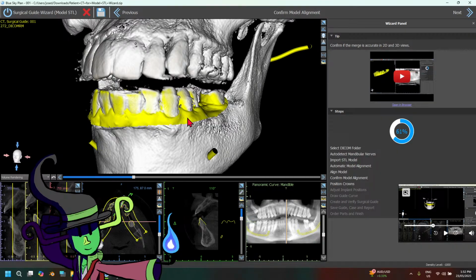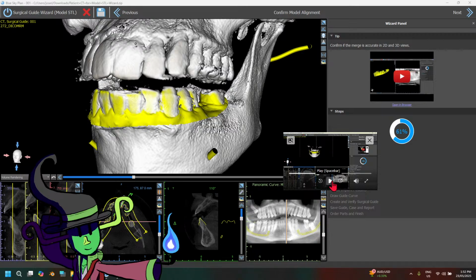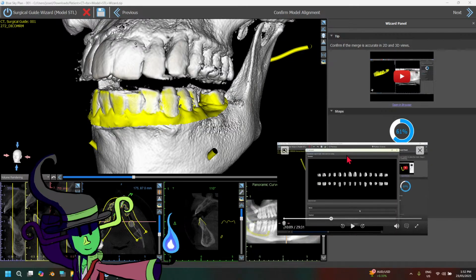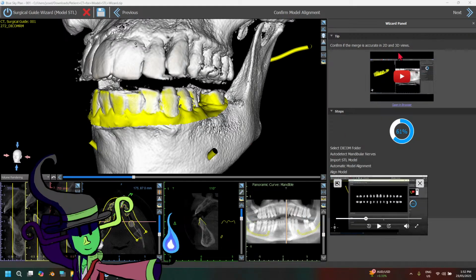Oh my god. Sorry guys, I just gave you COVID. See, we're already about halfway, with all this talking I'm doing. Anyway, I think I'm already done with alignment, so I'll move on to the next step here.